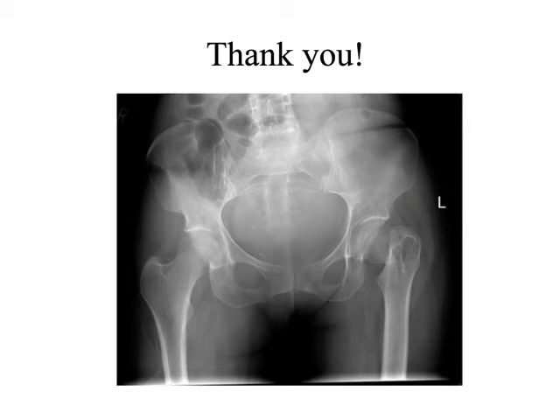Okay. What's going on with this picture? Let's describe what we're seeing here. It's overexposed, so it looks a little dark. We don't see as much, we see more soft tissue. Yeah, we've burned out some of our soft tissue.